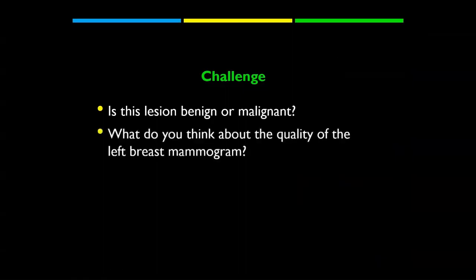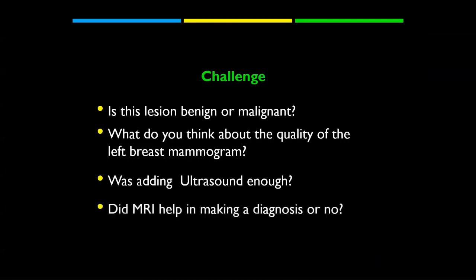And what do you think about the quality of the left breast mammogram? Was it a good mammogram, or do you think it was of a very low quality? And was adding ultrasound enough or not? And did MRI help in making a diagnosis or not?